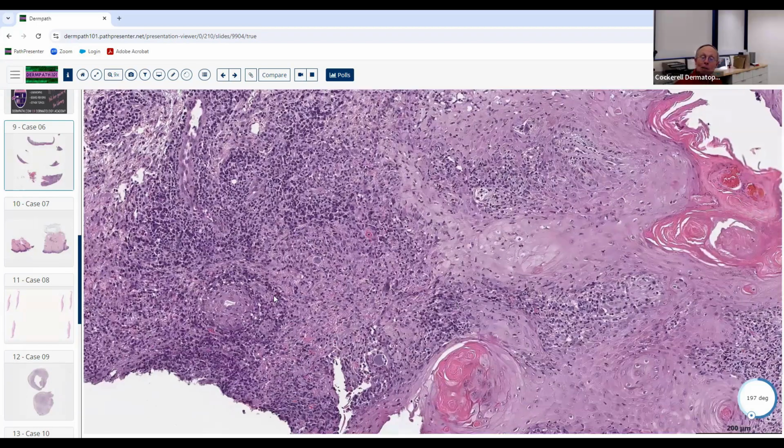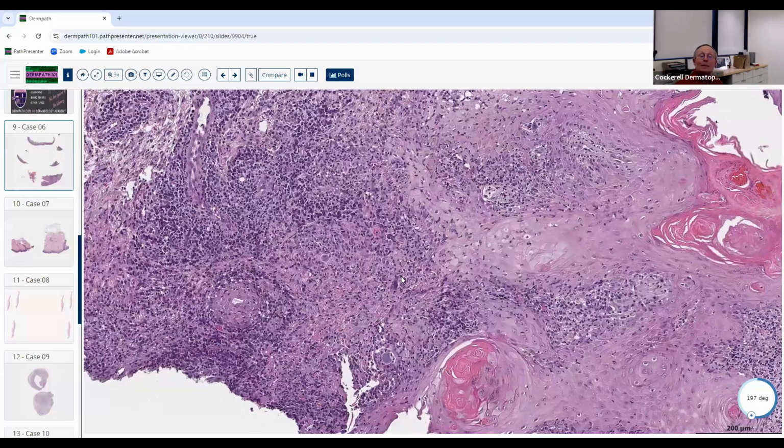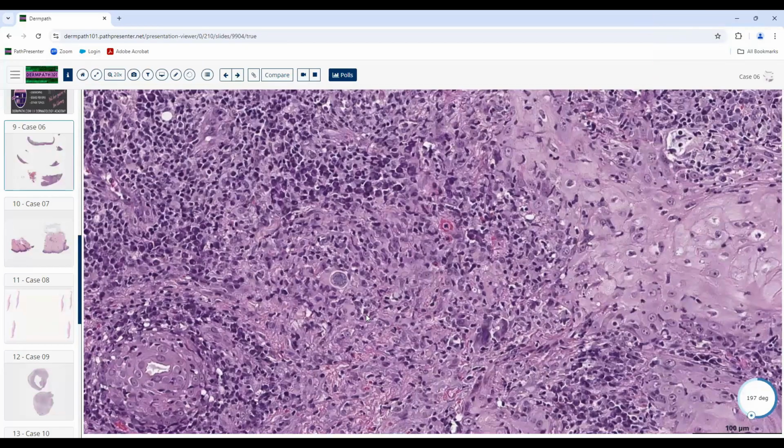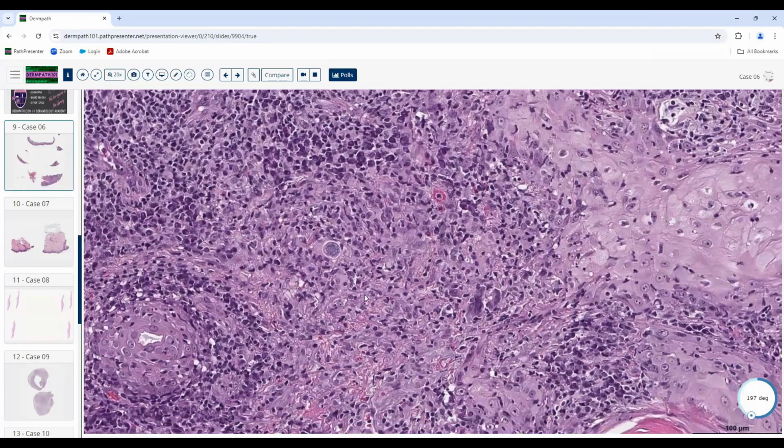So now we're going to higher magnification. We're going on a bug hunt. We're going to see if we see bugs. Did you see any bugs in here? Yeah, it looks like right in the middle, it's like a little spherule.